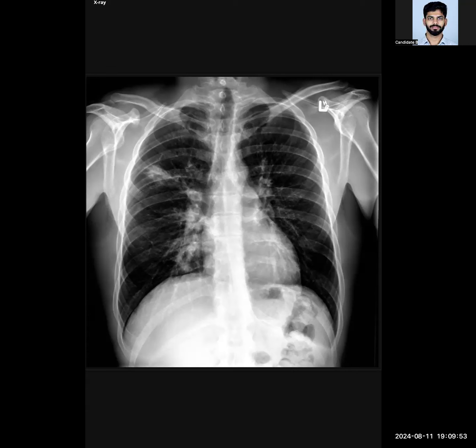What if I were to tell you that this patient is known to the hospital and has come in previously with similar episodes? Okay, in that case, I would think of a mucus impaction possibility with a prominent bronchi. However, I can't appreciate any similar finding on the left side.